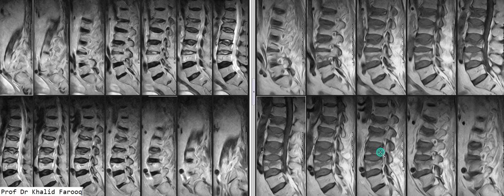The patient is 78 years old. He presents with a history of low back pain, and here we see abnormal marrow signals noted under the superior end plates of the upper four lumbar vertebrae, and we can also see that there is reduction in the heights of these vertebrae, especially through the central portion of their bodies.